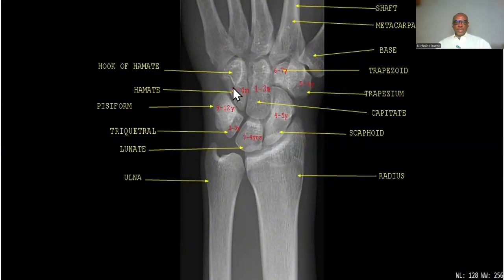In this specifically, this arrangement is such that if there's any malalignment in any of these carpal bones, then that shows that there's an abnormality, which can be further investigated with other views and the supplementary views as well.